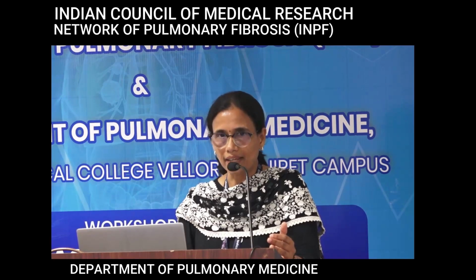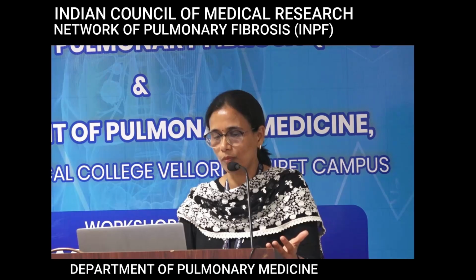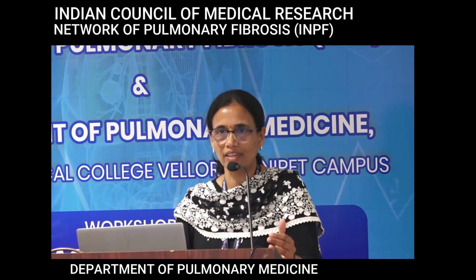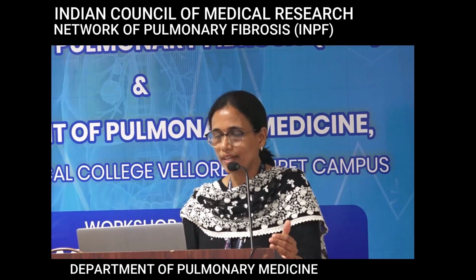So NSIP pattern again can be seen in CTD, can be seen, this is drug-induced bleomycin, the patient was on bleomycin. Various conditions can give NSIP pattern, and if there is no cause, then we can say it is an idiopathic NSIP. Let's go to the next case.